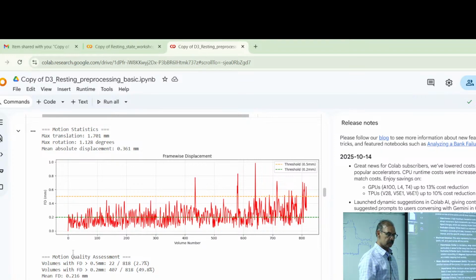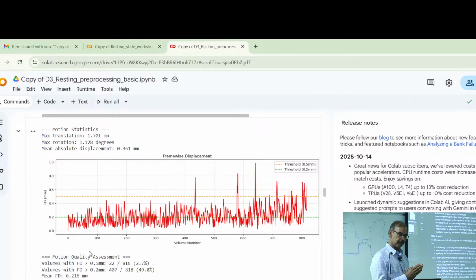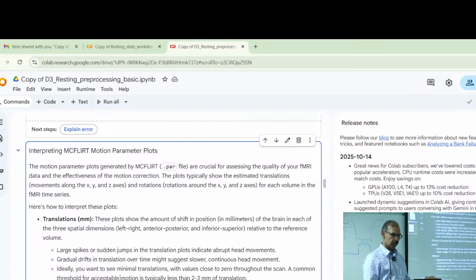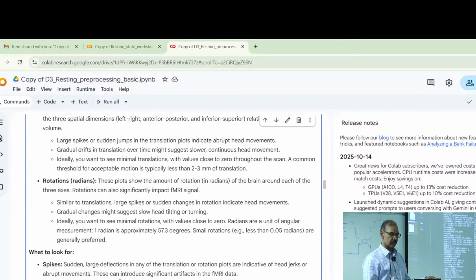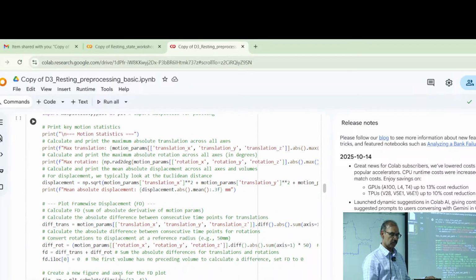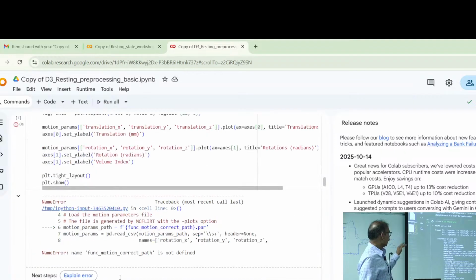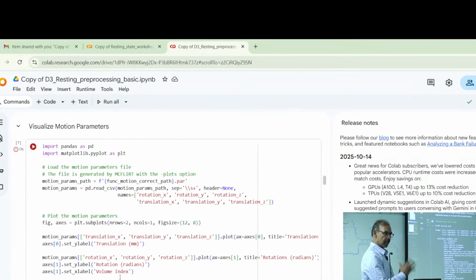Yeah. So after that, what we do is, it will of course correct, right? But if it's more than a few, let's say 2 millimeters, then I would check the data before and after, right? Okay, and this is, right? So again, this is doing, like, FLIRT is for transforming the anatomical data to the MNI template, right?